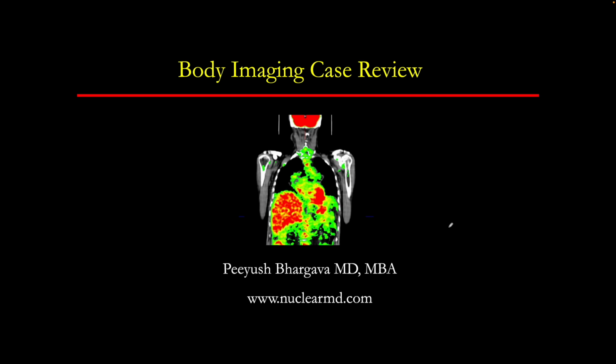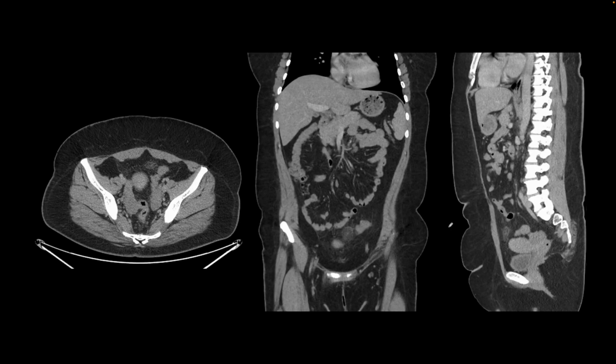Hi, this is Dr. Bhargava, and this video is the next in the series of body imaging case review. Our first patient presented with abdominal pain, and we performed a CT of the abdomen and pelvis.